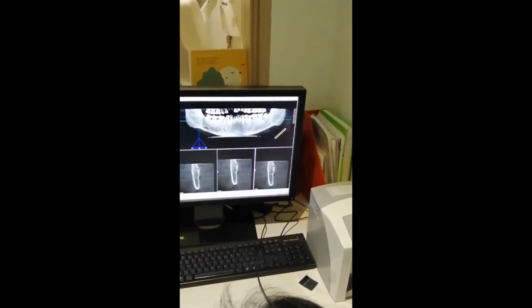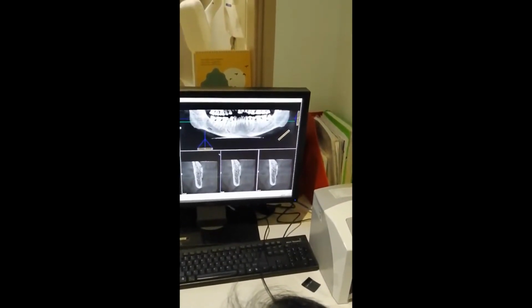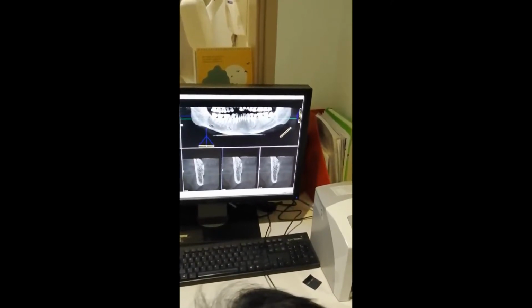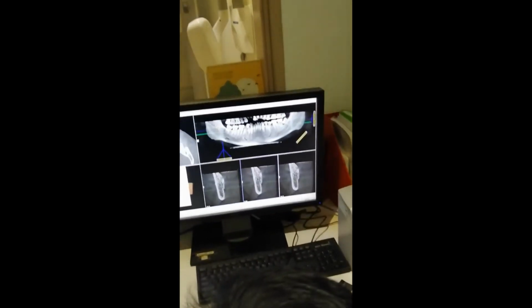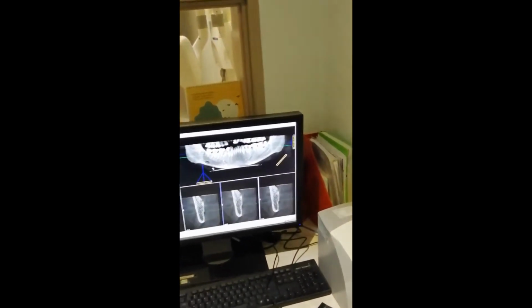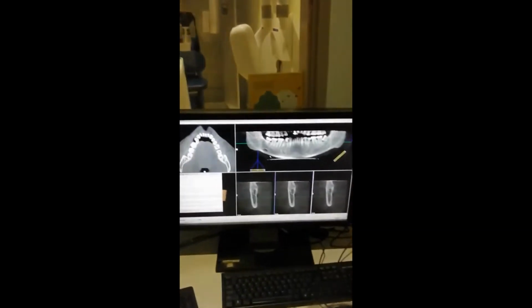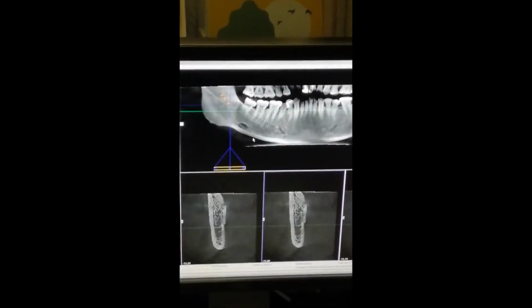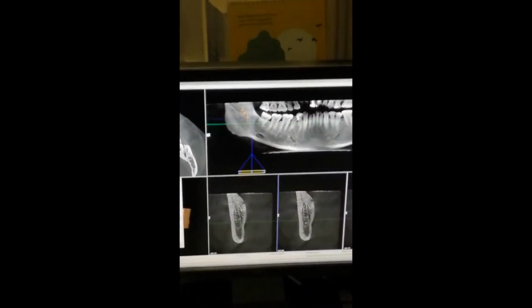Once done, I'll click complete, then it will give a, okay, I think it is wrong. So see, one I have measured here, so remove last point. If I make a mistake, I can do remove last point. Okay, now let me not jump here. Yeah, it is correct.